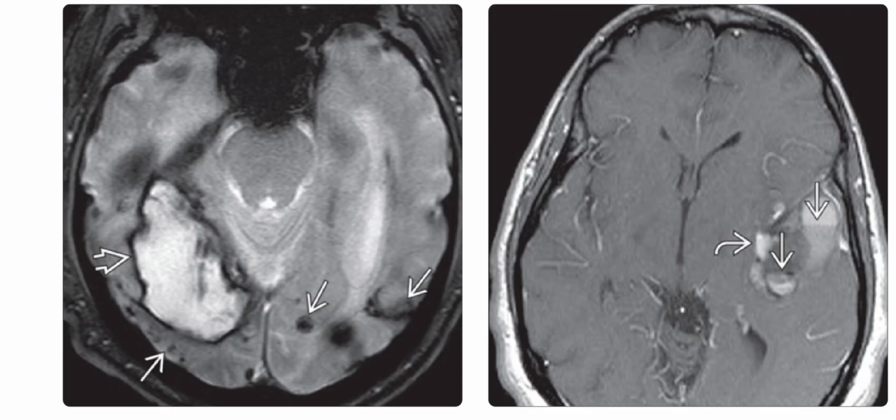Left image is the axial GRE image, and it shows a large occipital lobe hemorrhage and multiple other foci of susceptibility artifact or blooming related to hemosiderin deposition in this elderly patient with cerebral amyloid disease. The MRI was done to exclude an underlying mass.